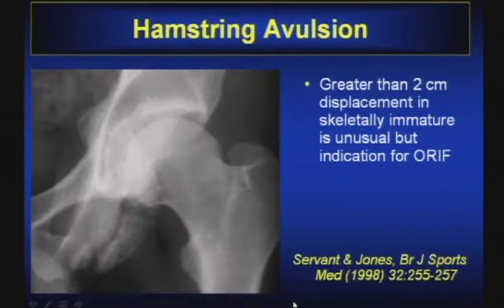Okay? So in this case, we're seeing a big area, almost like an extra piece of bone adjacent to a bone. And this is sort of a classic appearance at soft tissue attachment sites or enthesis all over the body when a patient has had an avulsive type injury in the skeletally immature stages. Okay, so when you get those avulsions, when you're skeletally immature, you get a lot of bone formation because of the vascularity in those areas. So this is very characteristic of a history of a pediatric avulsion.